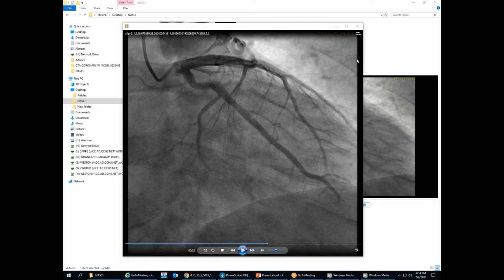So we do the cardiac CT. We do see dilated left ventricle. We don't see, at least on the first and the second glance, and not on the delayed imaging, on the CT areas of definitive scar, okay? We also see that there is extensive coronary artery disease, but no severe stenosis or obstruction. Now, what we do see is the anatomy of the left ventricle that would be very much inclining us to say that this is a non-compaction myocardium.